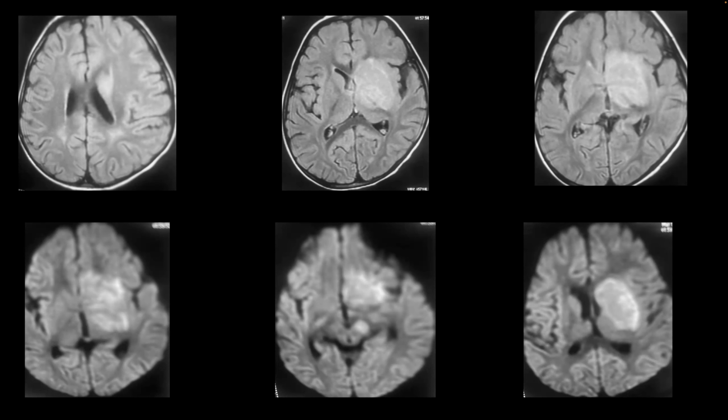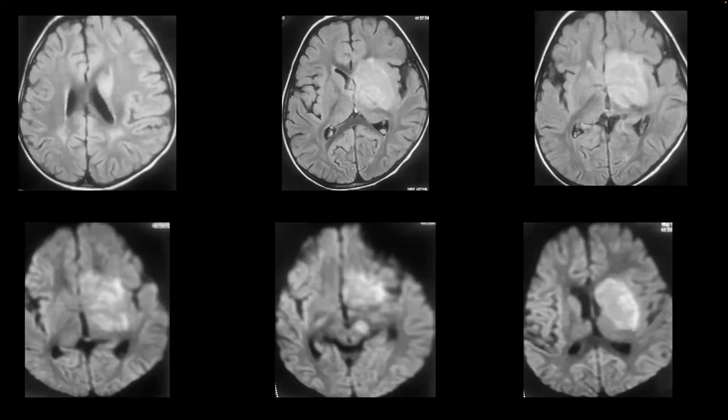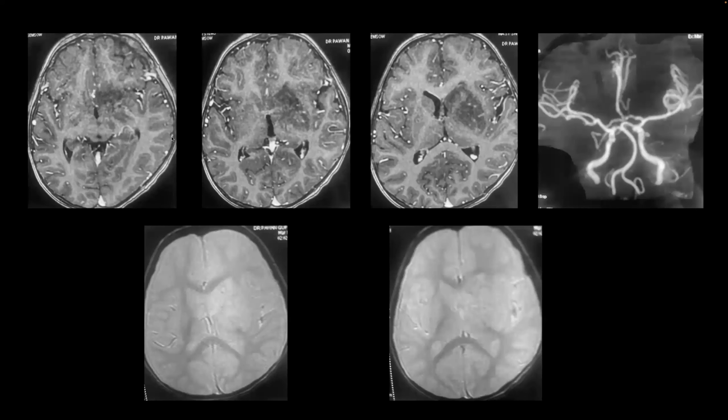Not much of inflammatory component. It's more cytotoxic edema, all of it, with some compression as well. Tumefactive lesions in the first scan, that's why I thought it could be that. The second scan obviously is very odd because it happened on both sides. And the contrast as well. The contrast doesn't again support. Right. I agree.